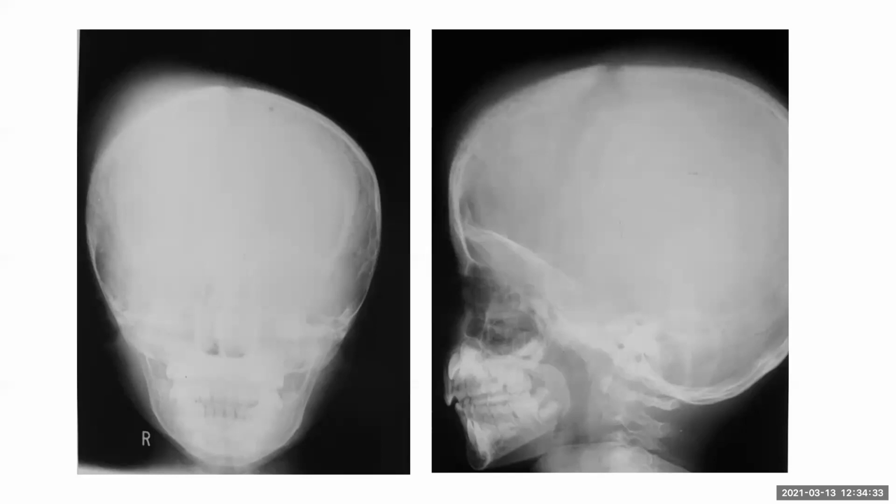The rest of the bones appear normal. The base of skull appears slightly hyperdense. The sella appears normal. I'm looking at the mandible.